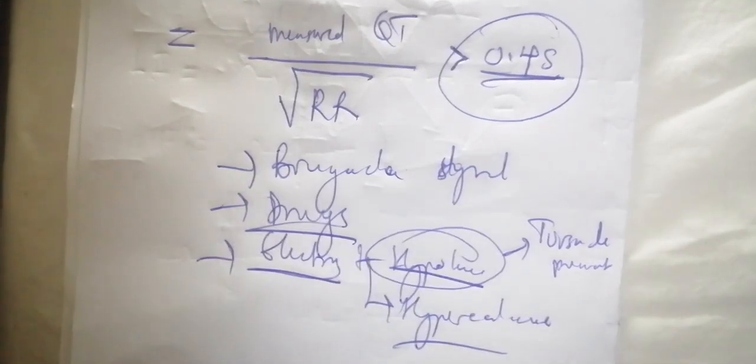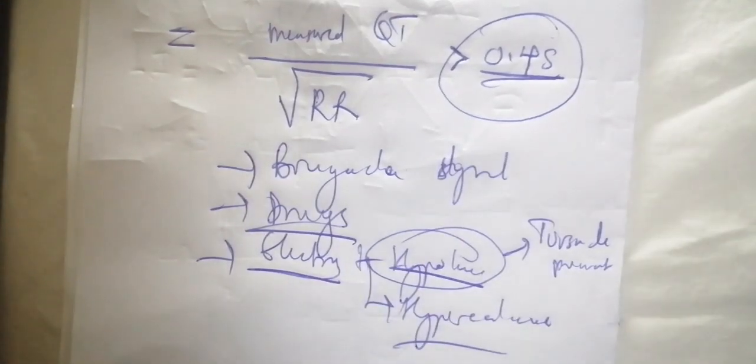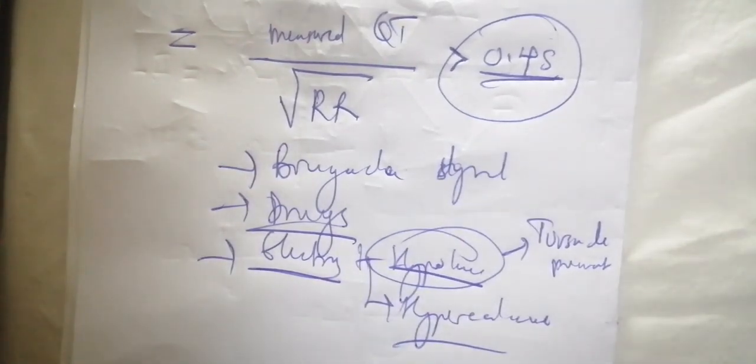So that is what is called torsades de pointes.